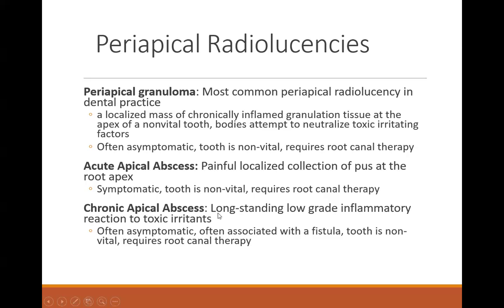Chronic apical abscess, long-standing, low-grade inflammatory.